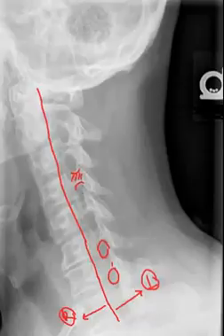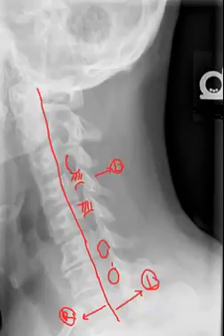This is the pedicle. More specifically, this is the left pedicle. Notice that the floor of any particular IVF is the pedicle also. So now we have two margins of the intervertebral foramen. Let's come up to the segment above. Let's draw our attention to the anterior margin of the intervertebral foramen.